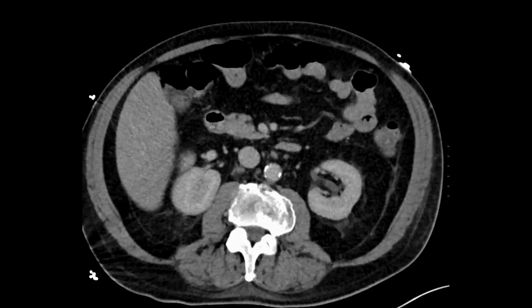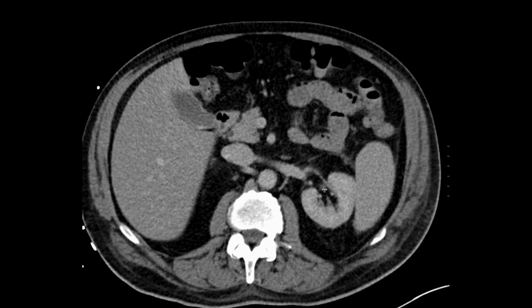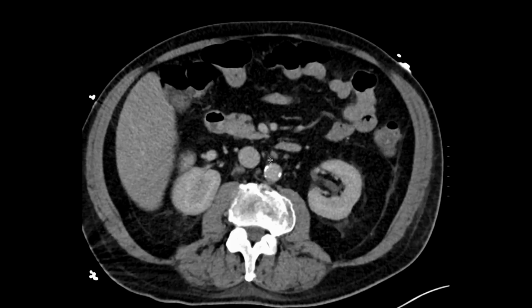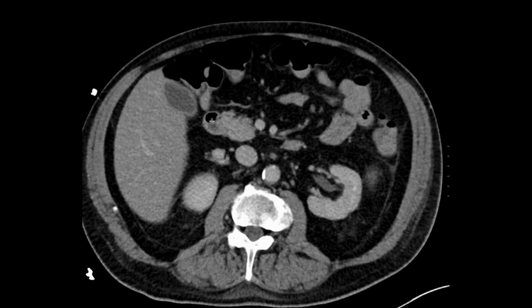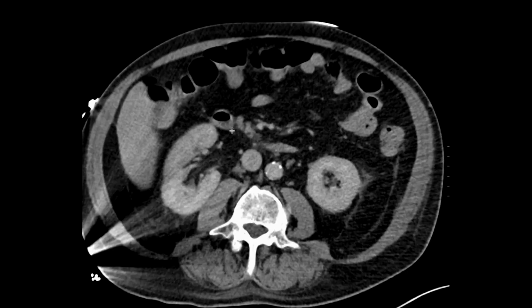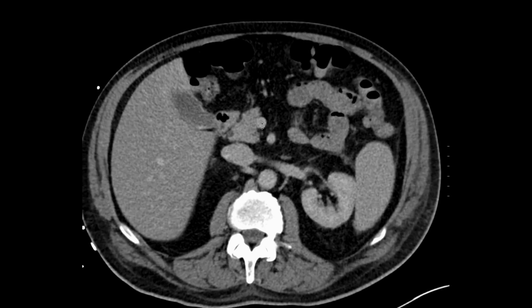Let's do one last review. Aorta, SMA, 2 tubes go between the aorta and SMA. The first is the left renal vein. There you see left renal vein going into big blue. And the other will be the duodenum crossing the ligament of Treitz. We'll trace the duodenum back into the stomach. So every case I check the duodenum, making sure it crosses the ligament of Treitz. I check that SMA-SMV relationship, look at the pancreas right there, make sure there's not a pancreatic head neoplasm. This is very, very important anatomy.